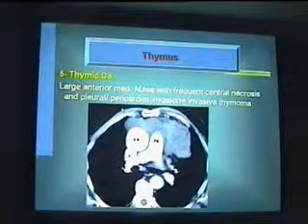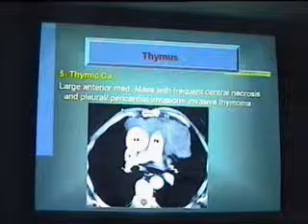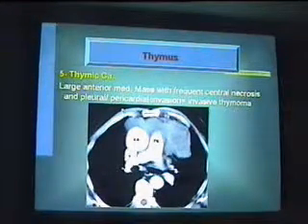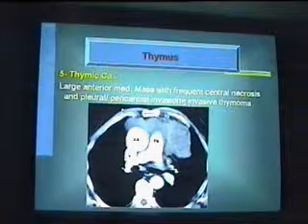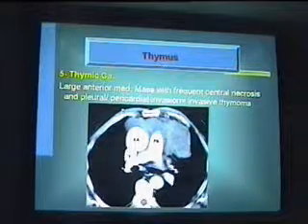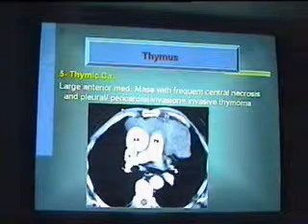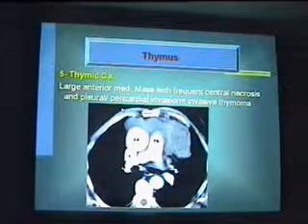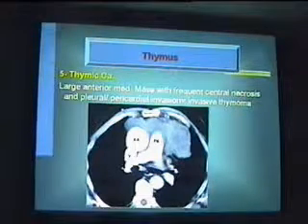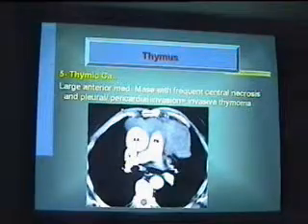الثايمس بتحب قوي البلورال والبريكارديال deposits. بتحب تبعت لهم deposits, being close to them فبتبعت لهم easily. أوكي؟ ودي طبعا تفكرنا بالinvasive thymoma. We can never differentiate between an invasive thymoma and thymic carcinoma. أوكي؟ Again نذاكر الأناتومي. This is the ascending aorta وراها الهمب of the main pulmonary artery with its right and left branches. ورا الأسcending على طول بيبقى فيه الكارينا.